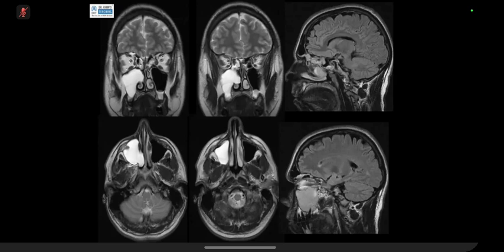Actually, inverted papilloma has a cerebriform pattern, and it comes from the ethmoid coming down. So one thing that would be helpful is to see if there is any focal hyperostosis. And the other thing, could that be just a polyp?